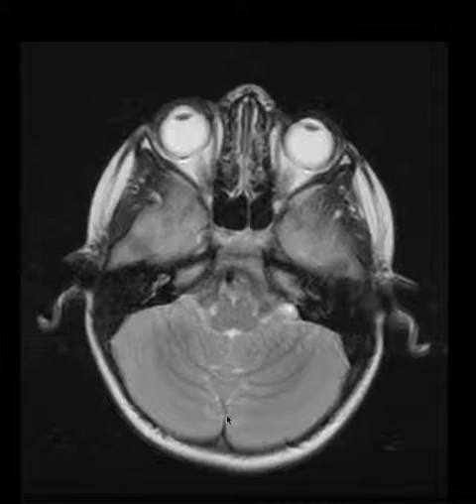Next, I'm going to outline the medulla oblongata. This is the medulla oblongata. Then we have this bright fluid here, which is CSF fluid, at the very bottom of the fourth ventricle.